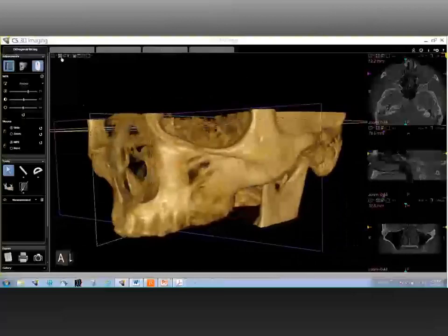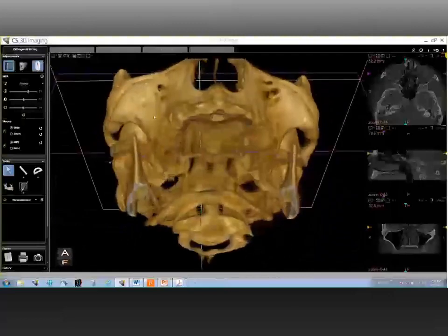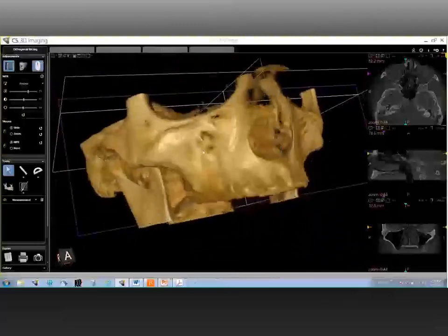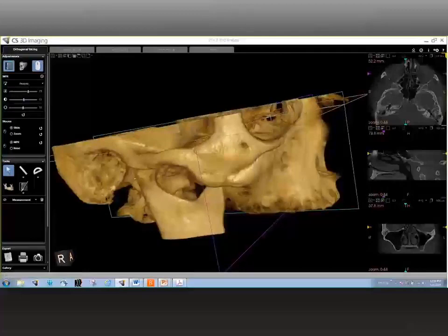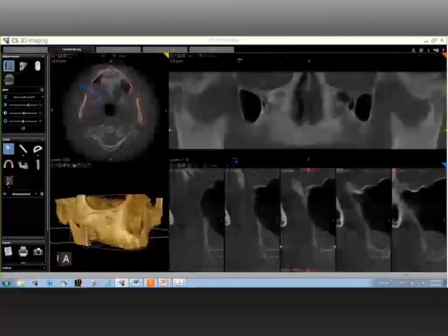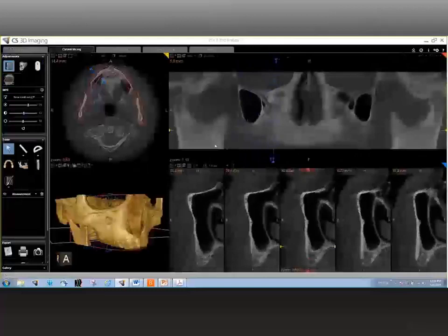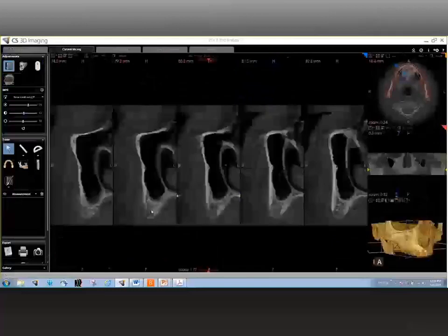Well, Jordan, that is a fairly simple question if you think about it. As with any other hard tissue, one of the most commonly visualized anatomical landmarks is the cortical bone, and by the cortical bone, we are looking at the integrity of the cortical bone as such. The cancellous bone, which is encased within the cortical bone, and you can see right there the cancellous bone.